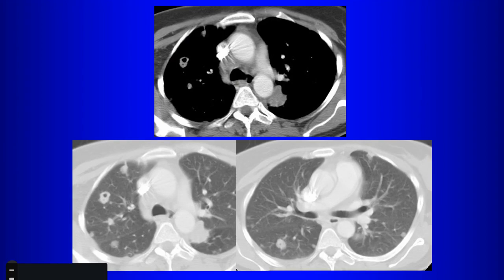Multiple cavitary lung lesions. So we have bilateral lung nodules, some of which are cavitary. The differential diagnosis here: you're going to think about septic emboli. You like septic emboli for this, yes or no? It's randomly distributed. Yeah, the distribution seems a little bit random. Does that bother you for septic emboli? No, that's typical. Typical? It should be peripheral. You're most likely to be peripheral. Yeah, so you're most likely peripheral, but it can happen anywhere. So certainly it's something to think about.